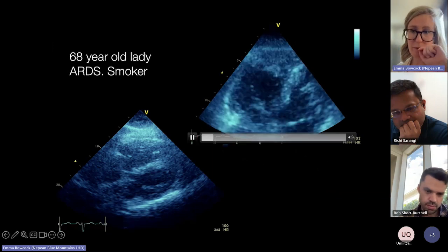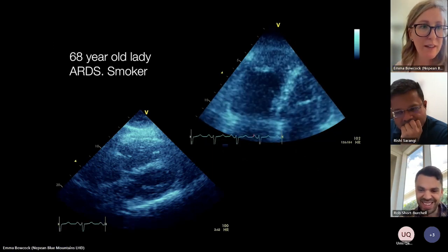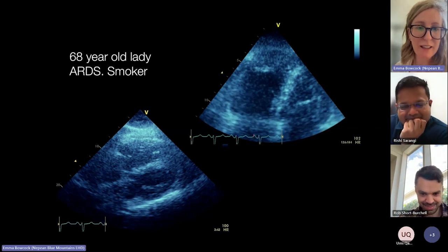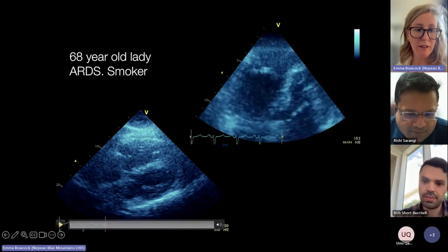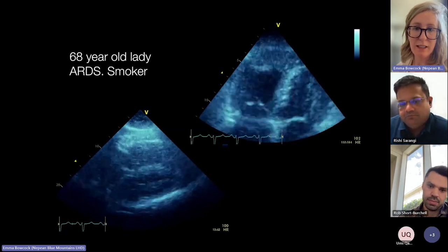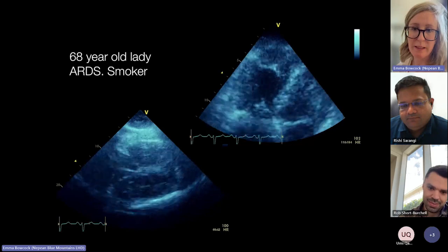So, someone other than Rishi, Rob, do you want to just comment on what you can see here? Let me play that again for you. So 68, she's come to us with ARDS and she's got a history of smoking. This is all you've got.